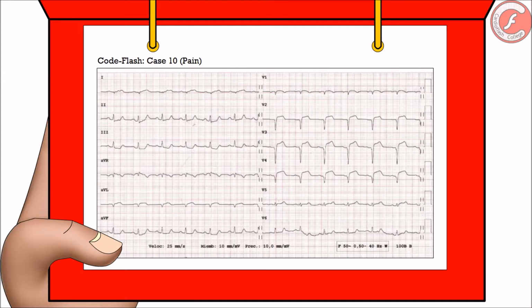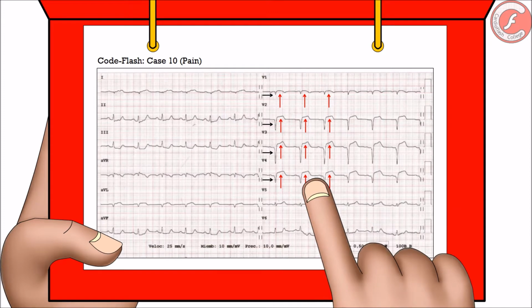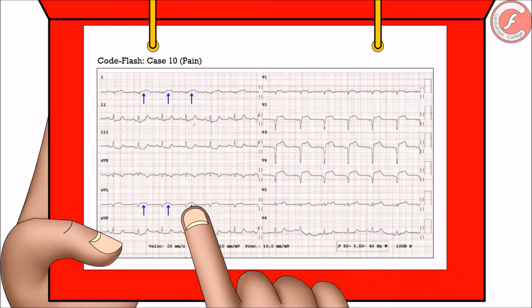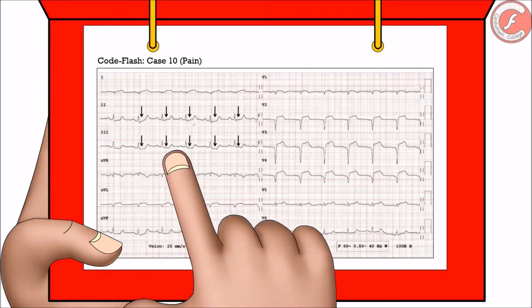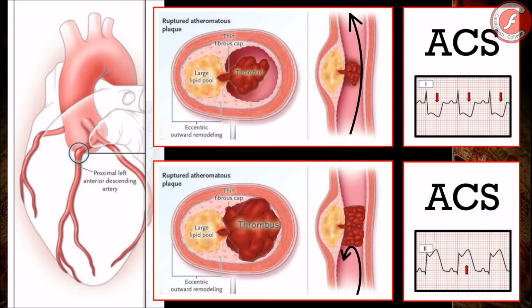That's it. In this electrocardiogram, we have QS complexes and an elevation of the ST segment on the anterior and lateral leads, and also a mirror image descent of the ST segment on inferior leads. This means that we have an acute myocardial lesion of subepicardial or transmural characteristics, sufficiently evolved to create a broad myocardial necrosis in the anterolateral region of the left ventricle, which translates into an ST segment elevation myocardial infarction in this case. But what clinical relevance does this have?